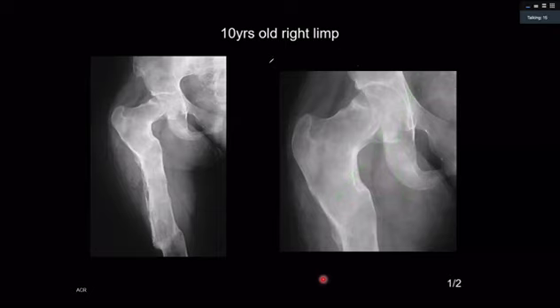Other than that, I think there's also some periosteal reaction evident at the lateral border of the femur. Right. What is this? So I think that's new bone formation essentially. So the lower down, it looks like there's been probably a pathological fracture, which is sort of malunited. Is it healed? It's healed, yeah.